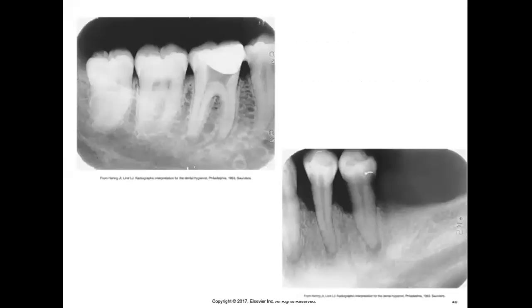And here we have a minor example of periapical abscess. Here, this tooth had a huge, ginormous pulp chamber. It was almost asking to have a root canal. Here, the dentist, when they placed this big filling, actually went inside the pulp chamber, which not surprisingly caused this tooth to become infected. And we can clearly see this radiolucent kind of halo around one of the apices of that tooth.